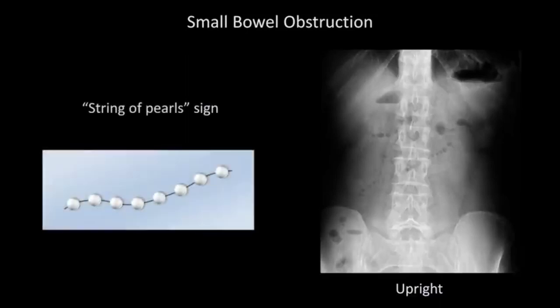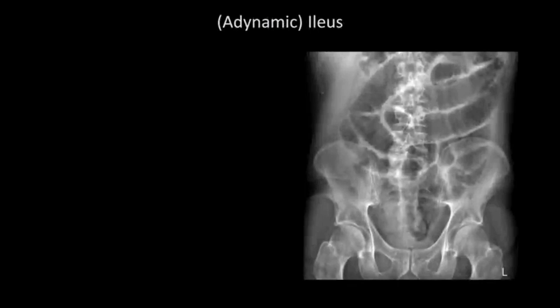A subtle sign of an abdominal mass might be displacement of bowel loops. Lastly, you need to look for other aberrant air, which means air where it shouldn't be. For example, you may have pneumobilia, which refers to air in the biliary system in the setting of gallstone ileus. You may have gas-producing infection, things like emphysematous cholecystitis, where you see air in the gallbladder wall, etc.